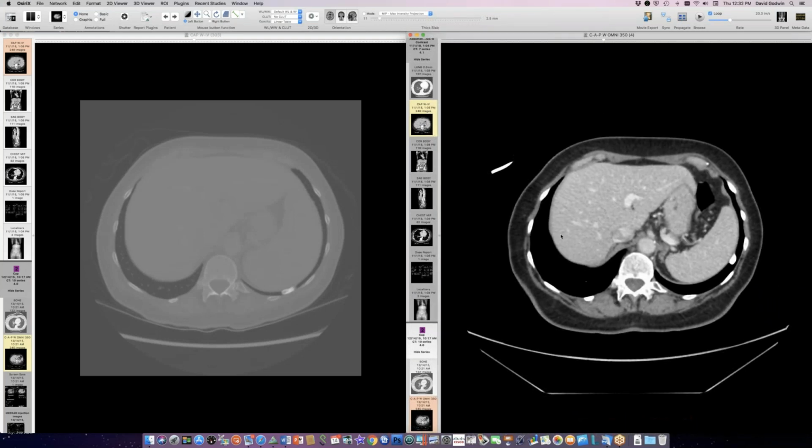So here's the original one. All right. So it is shifted about 20 degrees, and then on the most current imaging, it was not quite such a clean image. It has shifted farther medially now in just the last couple. So it is loose. Okay, we're going to call it a chest rat now. Okay, those are my cases. All right. Thank you, David. Very nice. That's interesting.